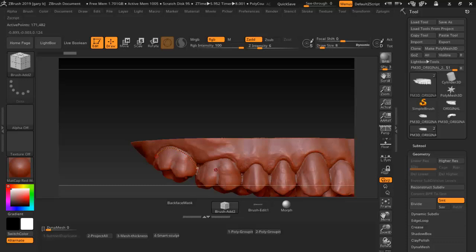As I hover over my line here, my guide, you can see it is one consistent line. Alright, this is a main factor. It has to be connected all the way around if you move it.